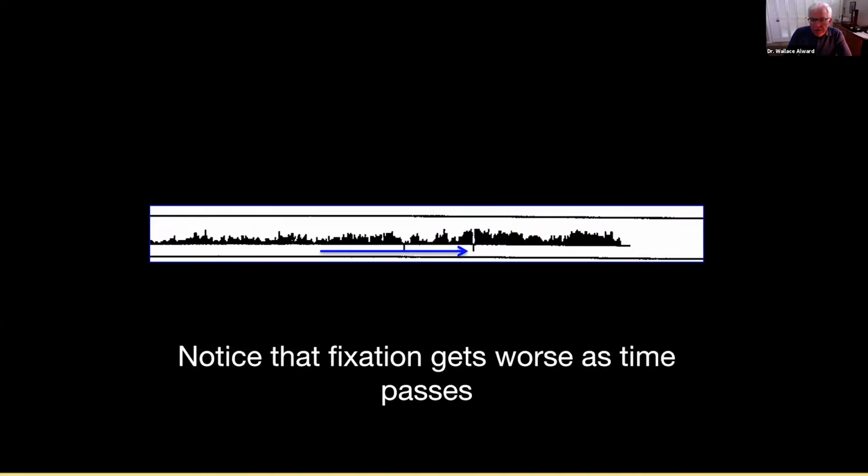So the gaze tracker to me is something that I look at in conjunction with, as we talked about before, fixation losses. Somebody whose gaze tracker looks like this, I would feel is really wandering a lot, and it's going to make me question somewhat the results.